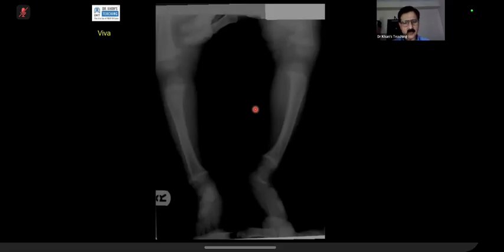How do you explain that? Diagnosis? Yeah, okay. Diagnosis. So this is a case of congenital syphilis. So, yes.